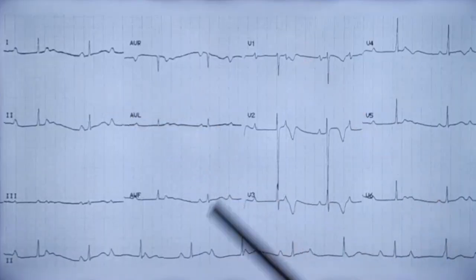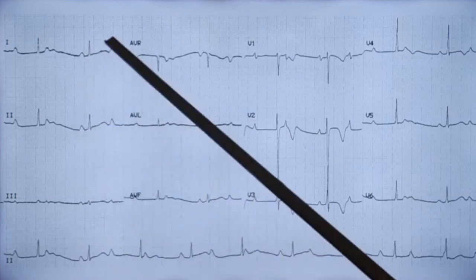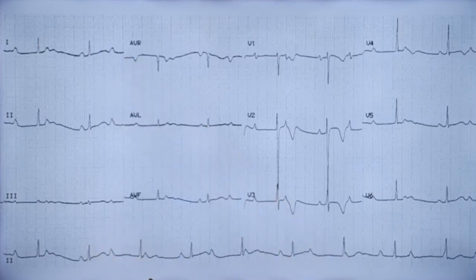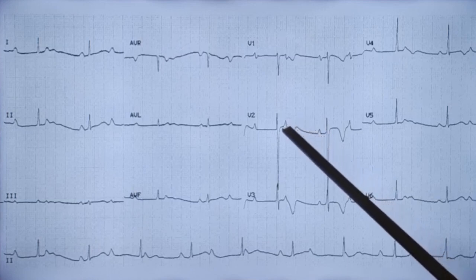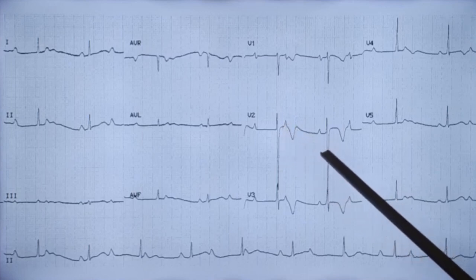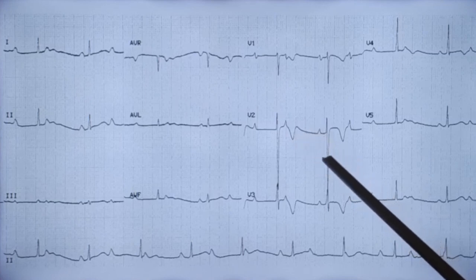If you have a look at this ECG, sometimes in this region you may pass it off as just a low normal heart rate with nothing else. But careful analysis in this region will easily tell you that this is one P wave with a fairly normal PR interval, but you have another P wave here which is not conducted. So for two P waves you have one QRS. We might be tempted to think that this is 2:1 AV block.